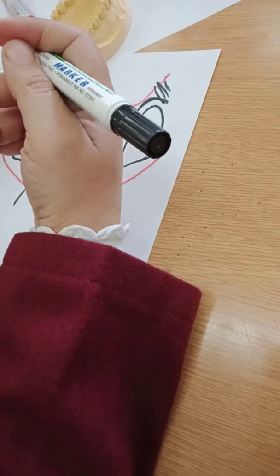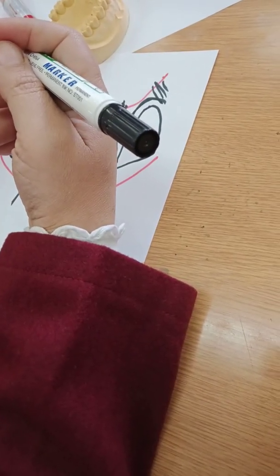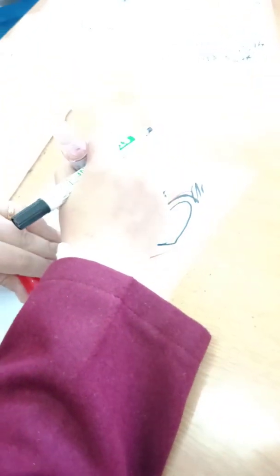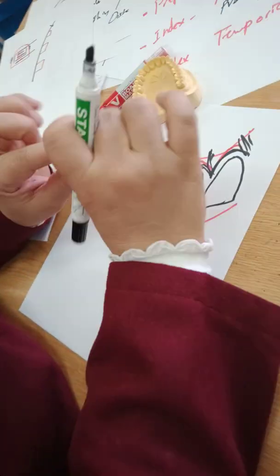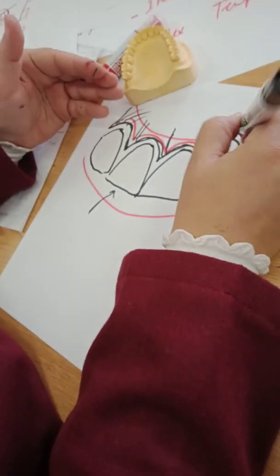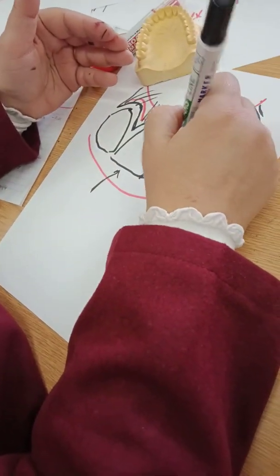The light body that you were talking about, you mean we take it from the cast and place the light body? Where is the light body? If I look at this, I will see the light body inside the index. It's running inside. We already placed it on the cast. Yes, on the cast, but then you put rubber over it. So when you see the index from above, you see two materials close to the tooth, because I want the marginal gingiva very accurately. When I do my mock-up, I don't want excess material going on the gingiva.